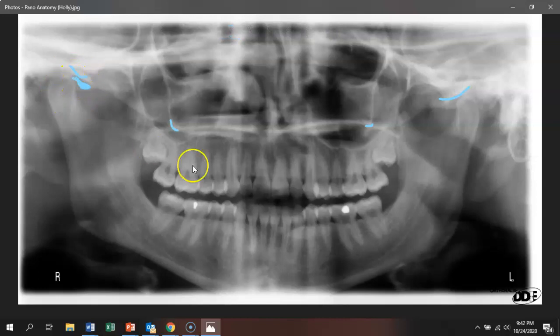It's a little bit whiter, but not as white as what I would think it would be. Actually, it's a little bit because of the patient. You can see they have a pretty good gentle smile line, which is what we want. But it does seem like something is a little bit out of place in here. There's an awful lot of white, so it's obscuring some of the bone. But do you notice one thing about right in this area? It looks a little dark, so I don't know that the patient had their lips completely closed around the bite block.